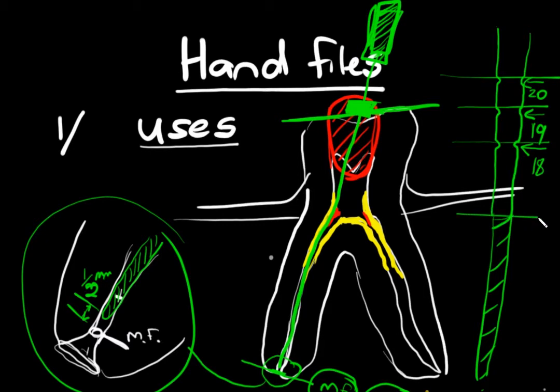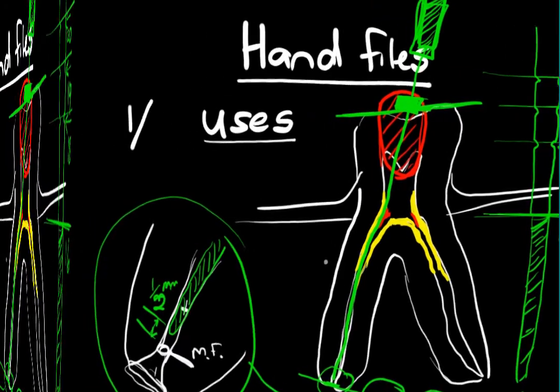Always on all the normal files, 99% of them that is, the flutes of the files here, they stop at 16. So the fact that you can see these indentations in the radiograph, you get a very good visual of actually the working length as it appears radiographically as well.